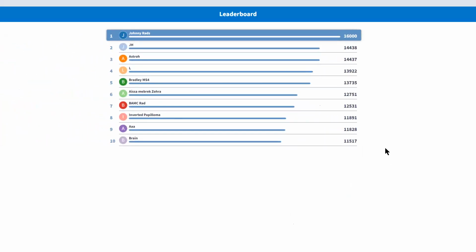I think someone had a question regarding the Paget's versus fibrous dysplasia case. Yeah, so fibrous dysplasia. So the imaging findings are ground glass attenuation of bone and marked expansion of the bone. Paget's disease manifests as also thickening of bone, but coarsening of the trabeculae, kind of maintaining its usual architecture, but it looks kind of thickened and coarsened and kind of fuzzy.